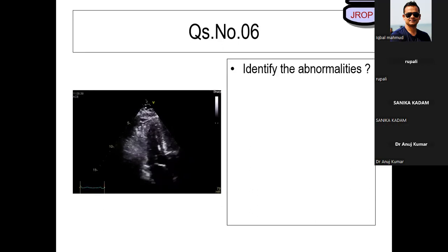Forget about the surrounding. Look at the cavity itself. Give me a clue. Mitral valve. Sir, it's chords crossing, and SAM. No, sir, there is some thickening of the annulus. Systolic anterior motion of the mitral valve? We can see more, there is no systolic anterior motion of the mitral valve. You are close by. These chords are crossing. This is chordal SAM.